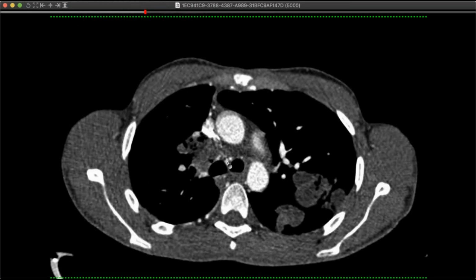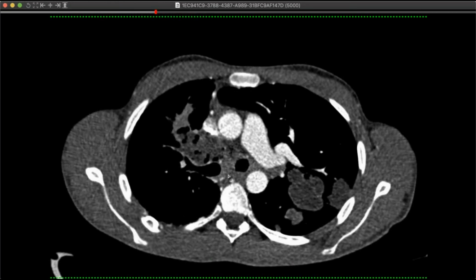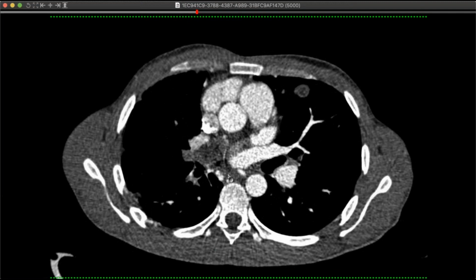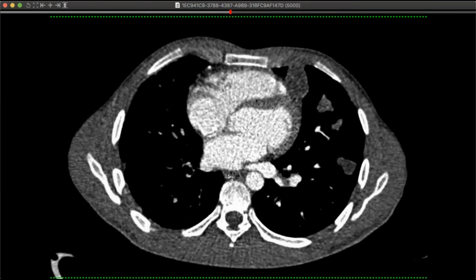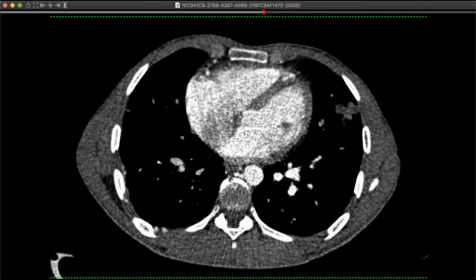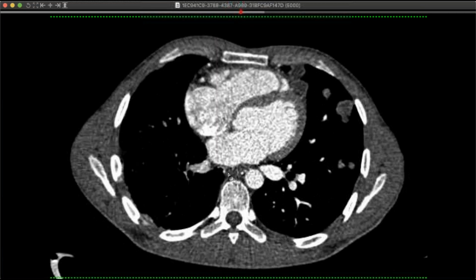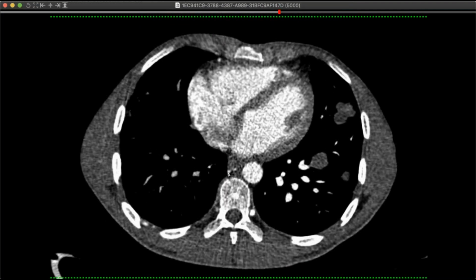And then you can see this pretty striking bronchial artery hypertrophy as well, which is almost like the level you see with cystic fibrosis and longstanding bronchiectasis. So they biopsied this, and anyone want to hazard a guess what this ended up being? A tropical disease. Well, Kashmir is actually very mountainous, so it's not quite tropical there, but apparently they see a lot of this infection there. But this is a case of hydatid disease in the lung.